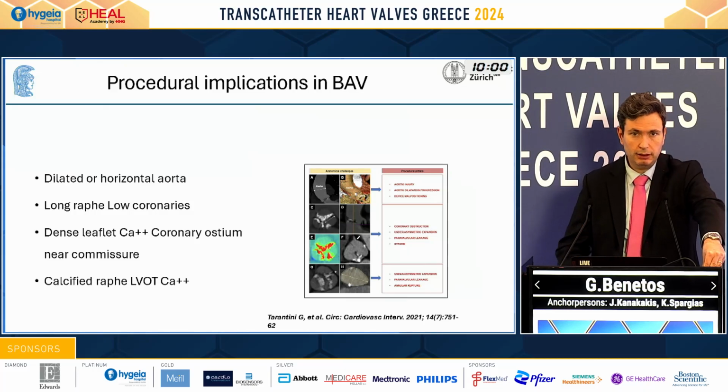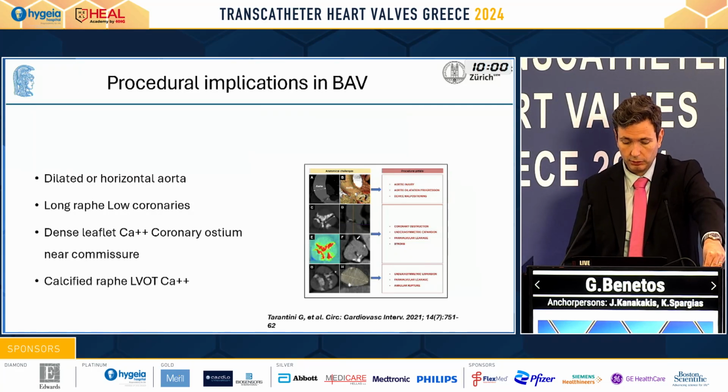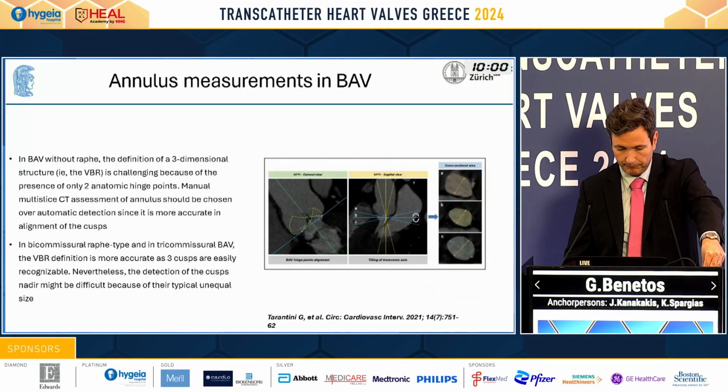You know better than me the procedural implications in case of BAV. We may have dilated or horizontal aorta, long raphe, low coronaries, dense leaflet calcium at the coronary ostium and near the commissure, and of course, which is very important, a calcified raphe or also a calcified LVOT.